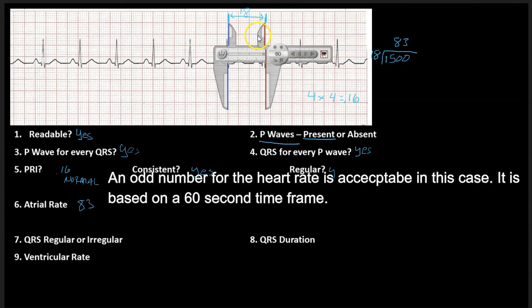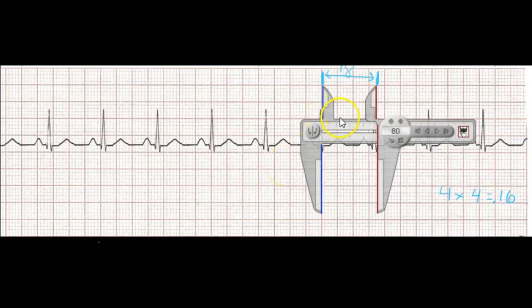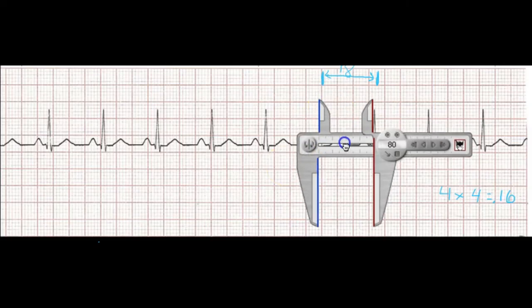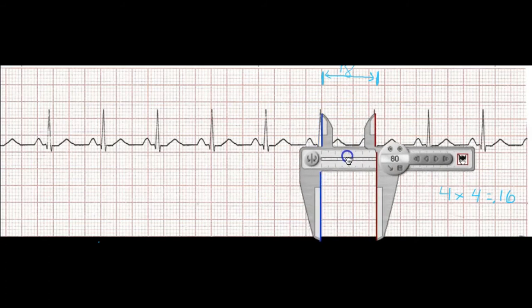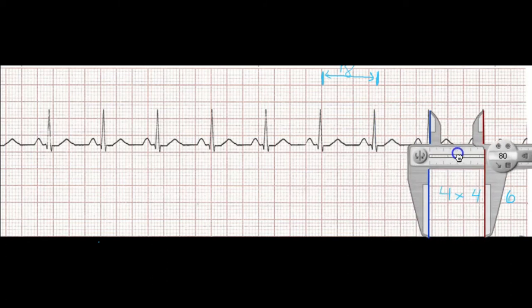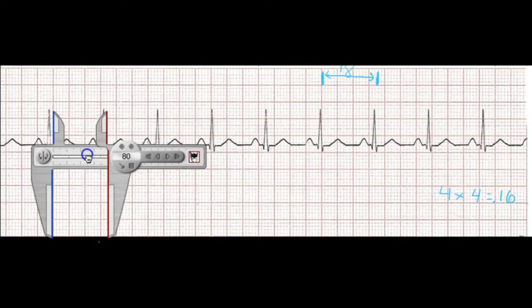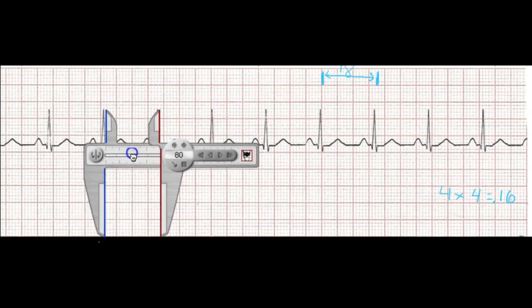By the way, I identified that this is regular. And now, again, little shortcut here. I'm answering all of my rolls. I'm just going to check here and see, and it is correct, that if I take from my P to P and I do an R to R, I can even go all the way down here, I will notice that it is regular.